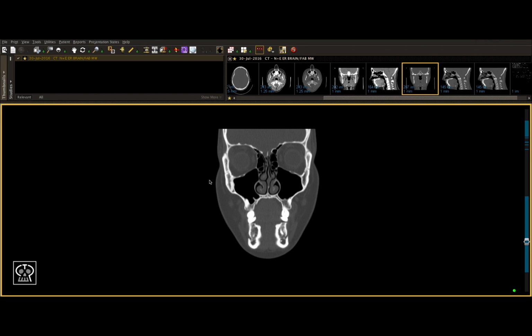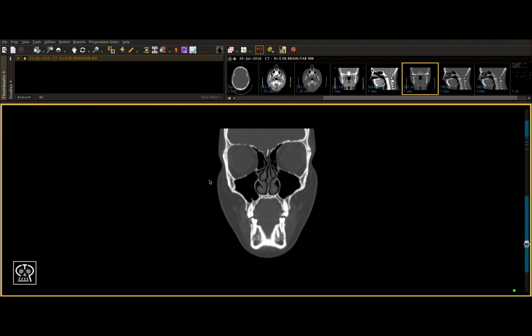For example, when doing your scan, you might not realize at first that you're dealing with the zygoma fracture, but you may notice fractures of the orbital floor, the anterior and lateral maxillary sinus walls, and you'll think, could this possibly be a ZMC fracture? You'll examine the 4 suture lines, and if you see fractures of zygoma or displacement of zygoma, you become highly suspicious that this pattern is a ZMC fracture pattern.